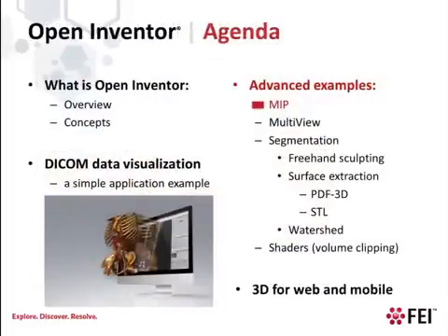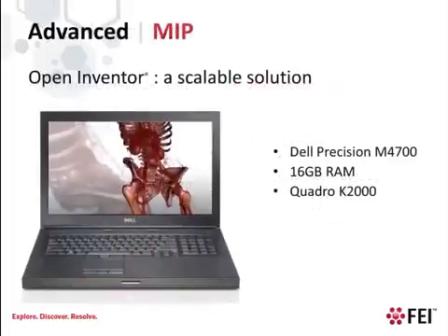Now let's look at some more advanced applications using Open Inventor. An important feature of Open Inventor is that it scales from high-end graphics workstations down to laptop machines. The videos you see in this presentation are running at actual speed and were generated on the hardware shown here.